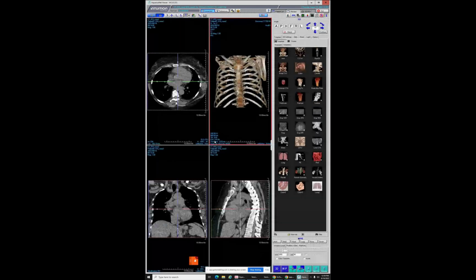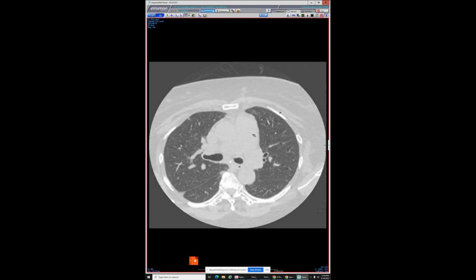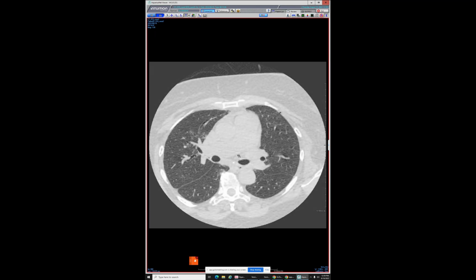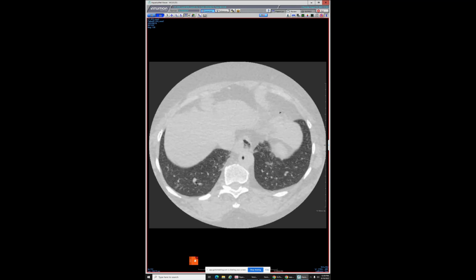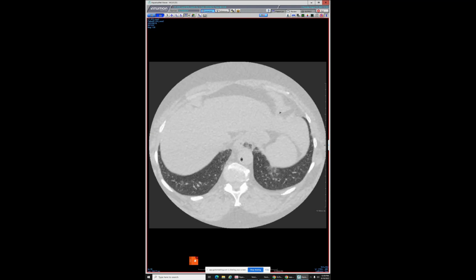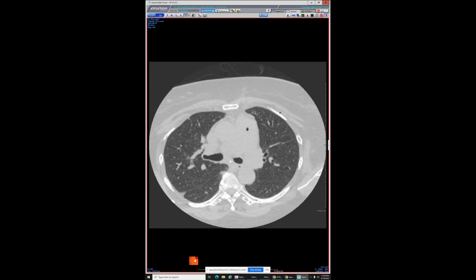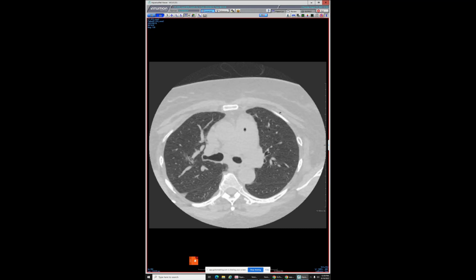We've all shown cases of people with trashed lungs, but I'm always impressed by the lung's ability to heal itself. So this is her now, a year and a half later. Really remarkable. There still is clearly some injury or fibrosis, some peribronchiolar scarring, but I'm really impressed about how well the lung was able to repair itself from that severe lung injury.